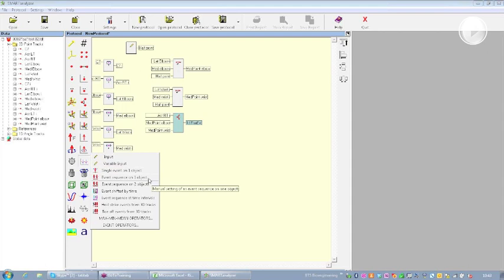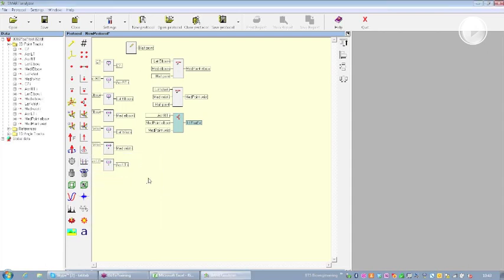In this case we have one input and of course one output. The output in this case is going to be a sequence of maximums. Okay, to make this operator work, I want to put inside an object that, in this case, is going to be the angle. So I drag and drop.